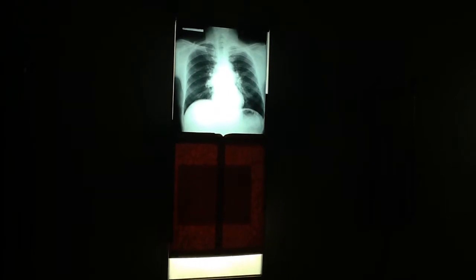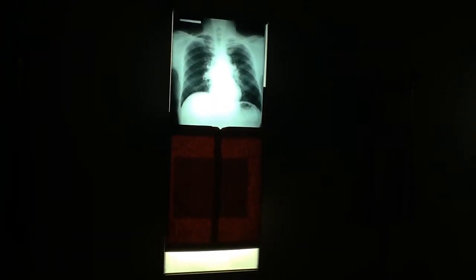And when hilar areas are big bilaterally, there's basically two main things that do that. What are they? Blood vessels, lymph nodes. Blood vessels are not lumpy though. Lymph nodes are lumpy, aren't they? That's the way we remember it. Lumpy lymph nodes. If it looks lumpy, kind of scalloped and lumpy looking, it's lymph nodes.